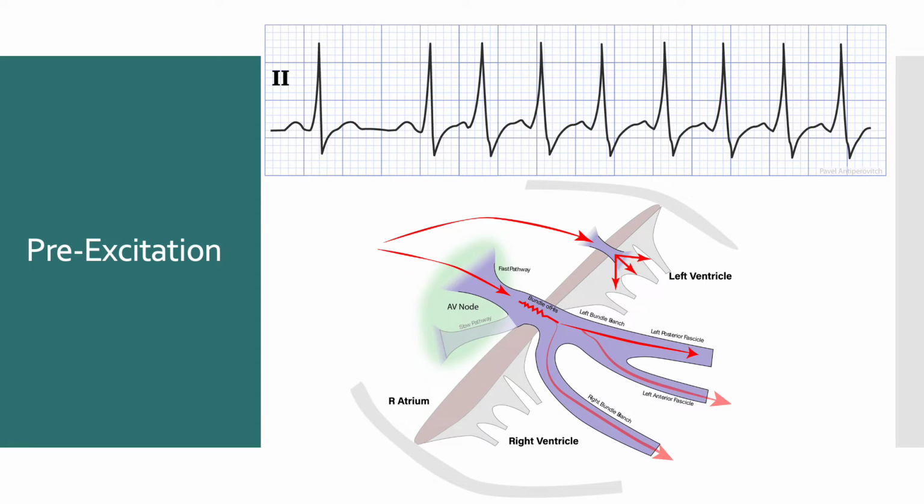With experience, you can look at the ECG and say, hey, this is not pre-excitation because it does not fit any pattern for an accessory pathway. However, the best approach for non-EP practitioners is to look at the baseline ECG in search for pre-excitation. If you see it pre-excited, pre-excited SVT is a real possibility, keeping in mind that it is possible that pre-excitation happens only during tachycardia. Overall, this entity is fairly rare in a non-EP practice, and we can usually skip it, but keep it on the back of our minds.